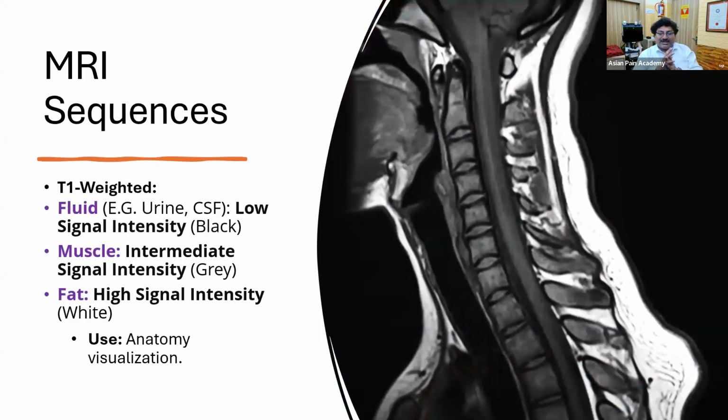Now there are a few MRI sequences. Some ask, what are those MRI sequences? Are they like an X-ray taken from one side that we are inverting? The answer is no. Actually, it is the different time phases of emission at which the signal is taken and through which the image is generated. Based on this, we have standard MRI protocols and standard time frames. By seeing those, we can get information about a specific structure.